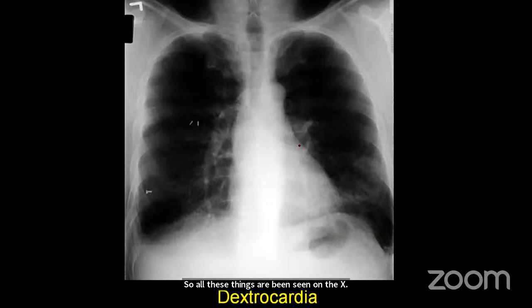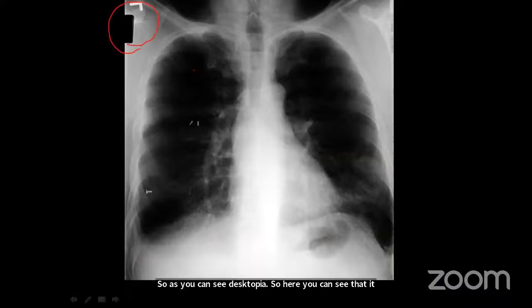What is this? If you can see, this is dextrocardia. Here you can see that it is written left. So this actually should be the left. This is the right side and this should be the left side. So the heart is actually on this side. So it is a dextrocardia. The X-ray film should have been kept reverse.